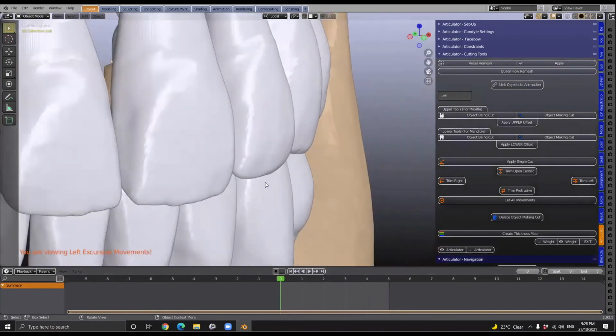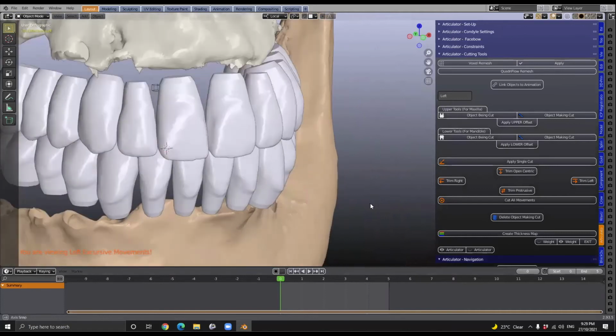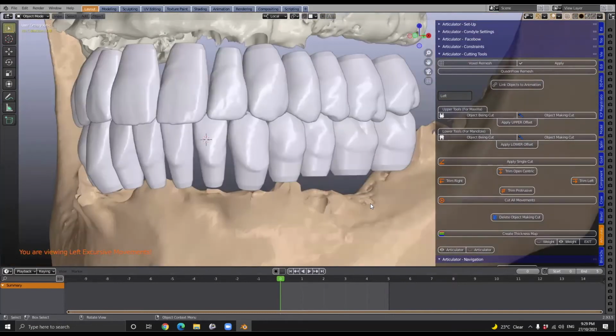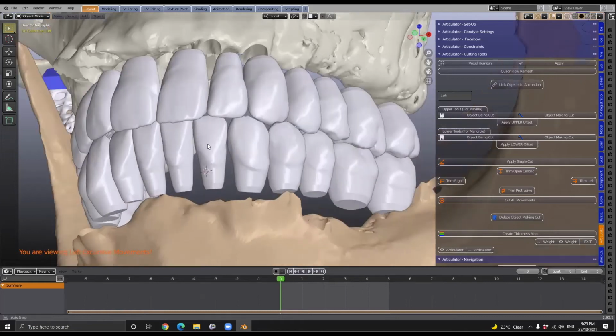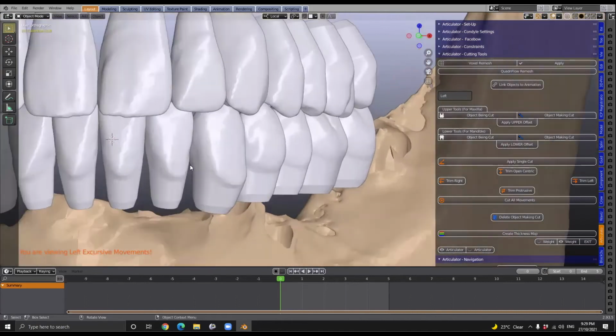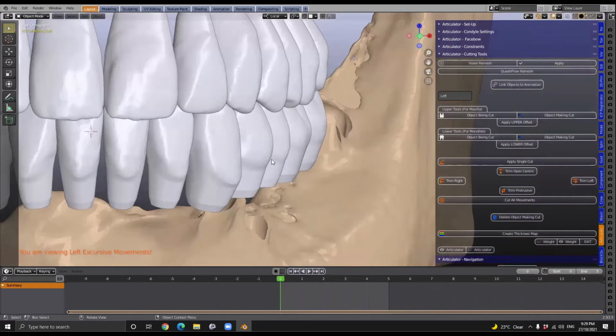Michael, some of our users have made a cut and then they've made another cut on top of the previous cut. Can you explain to us what might occur? Well, your model is going to disintegrate into many pieces, and your computer is going to take ages to think, because you cannot make a Boolean cut on top of a Boolean cut. It will never work. But if you've cut it once and you want to cut it again, then set the offset to 0.11, and then it'll cut. So you're making the cutting tool that little bit larger so that you're cutting away from the pre-existing cut surface. Is that correct? 100% correct. Okay, so that solves the problem.